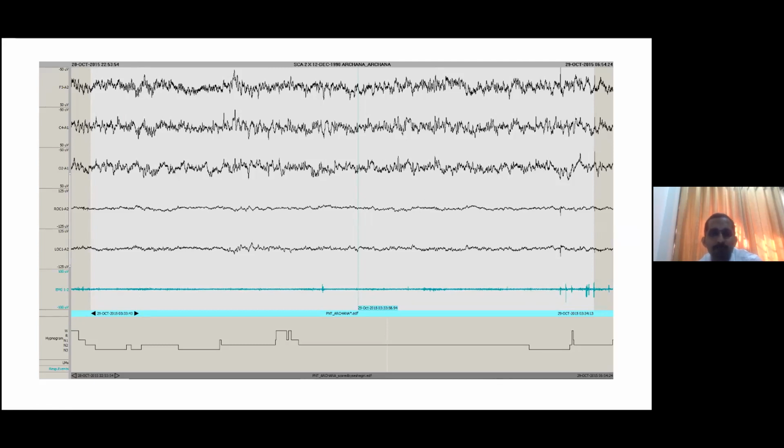You won't find a good number of sleep spindles in the entire record. If you find even one sleep spindle somewhere, it can change the complete picture of your scoring, whether it favors N2 or REM sleep. So we should be very careful in searching for where the sleep spindle is, particularly if the patients are not generating a good number of sleep spindles or K complexes for you to recognize.